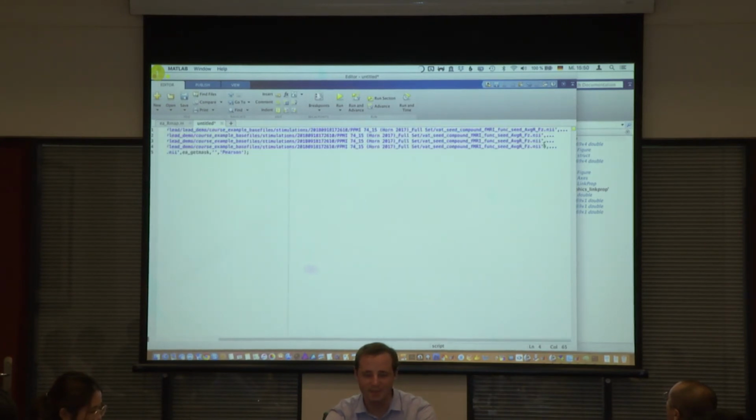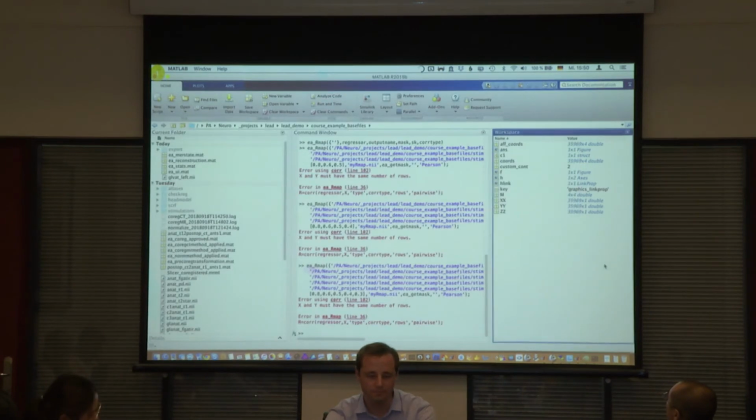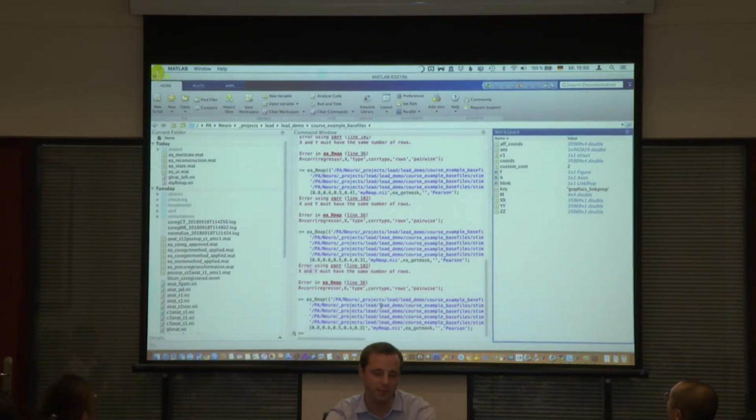So usually this works pretty well, but usually we have at least 20 patients or so. Yeah. Now it works.